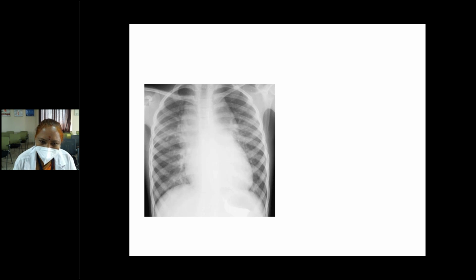But among these, clear, important and common conditions will be taken and given in your practical examination for orals. This is for completion, because you should gain your knowledge. You may be asked one of these X-rays in your PG entrance examination also, and it will be useful for your general medicine X-rays. Anybody voluntarily read this X-ray? Try to read.